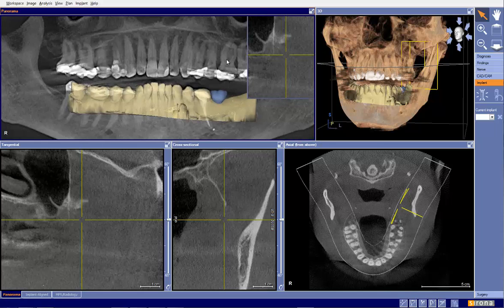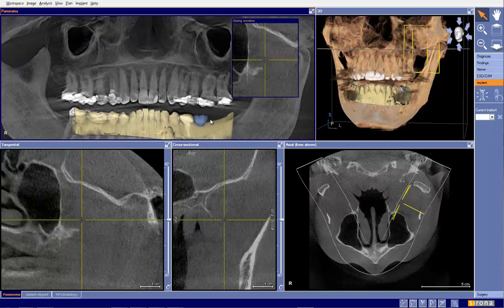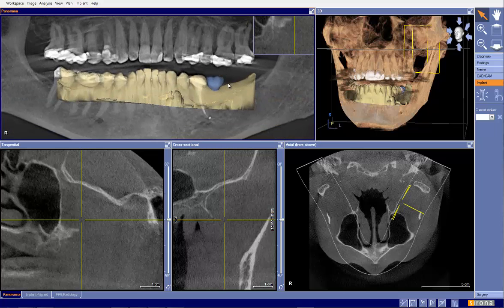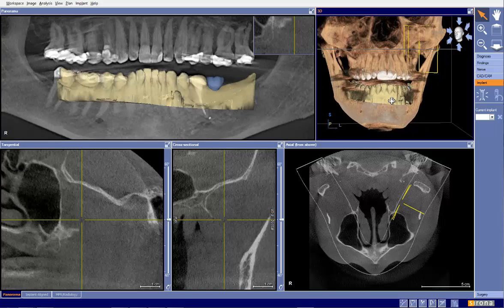And another point I would like to bring up here in this particular one that's very well done is we can see that we have some tissue extension. And the reason I like that is I will often ask CCAT to go ahead and make part of the guide do a little tissue extension there. So we're not solely relying on the teeth, but we can also have a little bit of a tissue stop for our surgical guide to rest on the tissue. That does help with stability and making things a little bit easier working there.